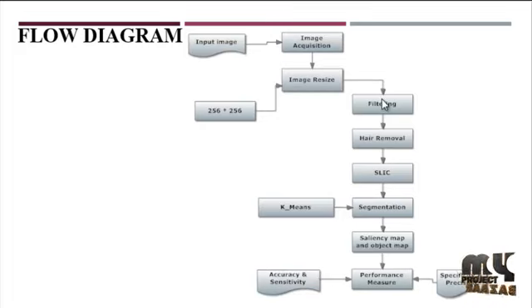Image noise is most apparent in image regions with a low signal level, such as shadow regions or underexposed images. In this module, we are also removing the hair in the skin region, which is very useful for further processing. The pre-processing stage contains image resize, filtering, and hair removal.